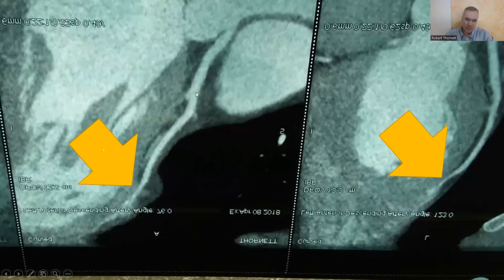But here it comes, and there's some black stuff in between here. But it goes out, and then you can see the arteries. In other words, the width of the artery stays pretty consistent down like this until the garden hose getting stepped on right here, right? It just becomes real narrow, real quick. We talked about smudged and faded and blurry and grainy and choppy and all that, basically all the way down.